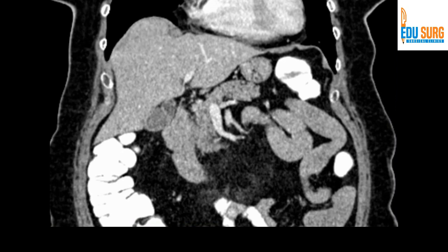So I hope this CT viewing series will help you in viewing your scans on your own on the console with your radiologist. And I hope that this video will help you understand the tributaries of the portal vein. It can be different in each case, and I have tried to highlight some of the variations that are commonly present. So keep viewing more and more scans.